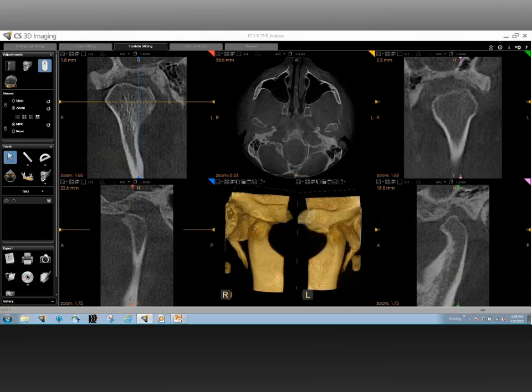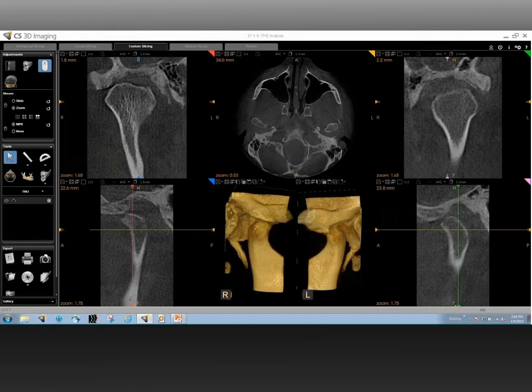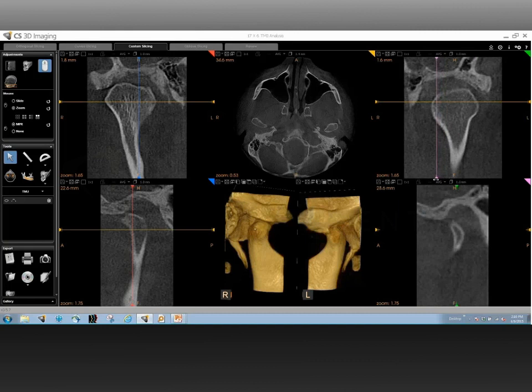By going through these slices, one of the biggest advantages is that you're able to now see different areas and different aspects of the condylar head and be able to individually segment out each single area. In this particular view, you do notice that the cortical bone itself has degenerated, and there's a break right there. So again, it emphasizes changes, remodeling. And for the sake of consistency, we are going all the way to the medial pole. And let's just stop over there and shift over to the other condyle.